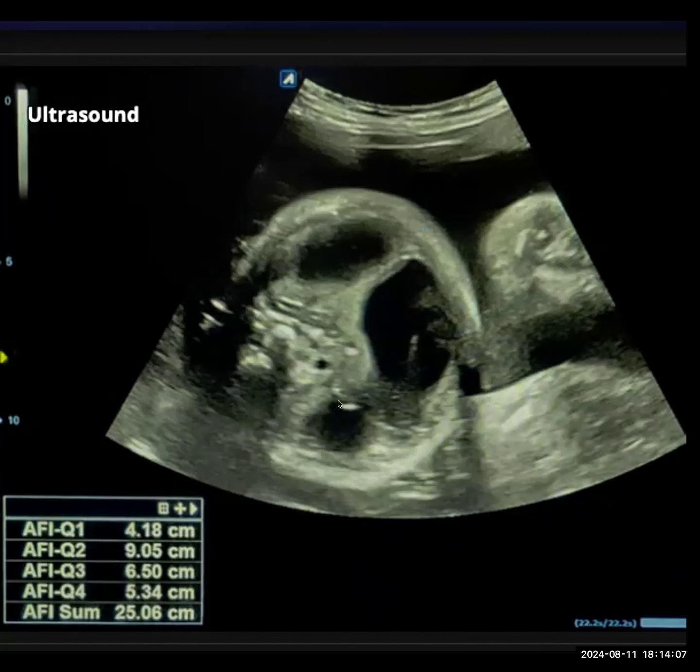So what do you think? Since you've been just given a static image, can you interpret anything from the bowel that has been shown to you? Multiple dilated bowel loops could be seen with such a calcific area. It could be a neoplastic etiology within the abdomen, which might be causing an obstruction, like a neuroblastoma.